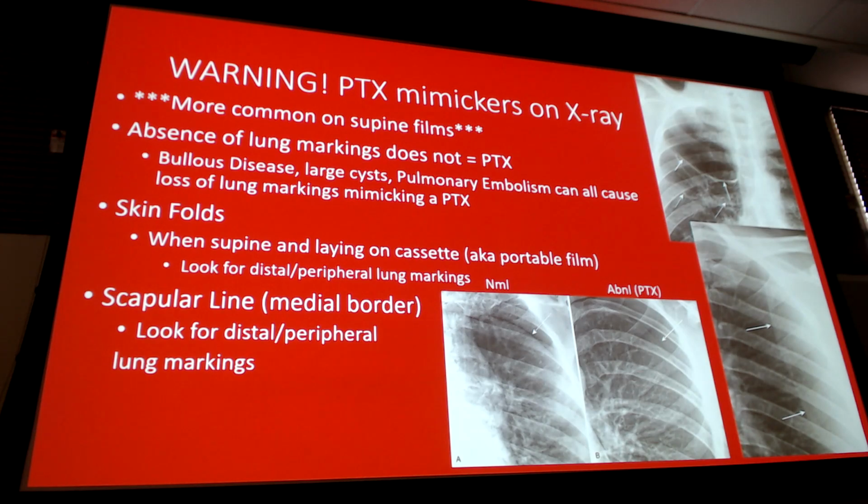Okay? Now this one is not about the pneumothorax. We talk about things that look like pneumothoraces that aren't. I'll skip over the scapular line because we just talked about that. The medial border of the scapula looks like a pneumothorax, but isn't. Here are some other things.